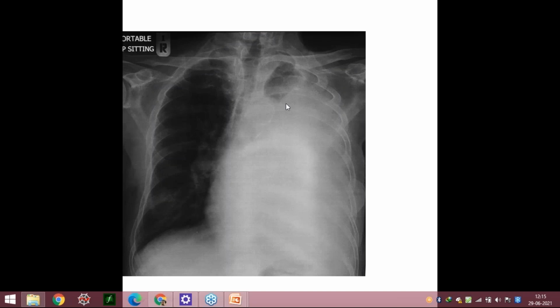Okay, so where were we? We are talking about this: we are able to see a slight aspect on the left side, but the rest of the area is opacified. So in this X-ray, left-sided pleural effusion or empyema, yes, you can keep one differential as that, because that will explain your mediastinum being shifted to the right side, your trachea being pushed towards the right side.